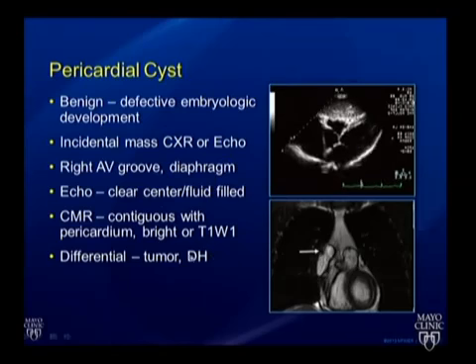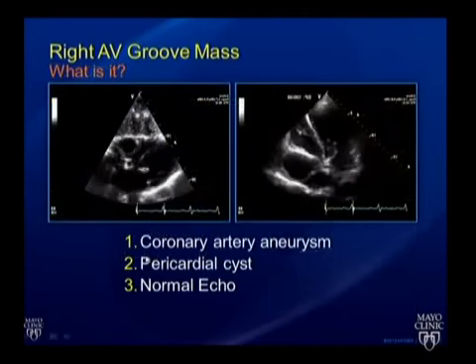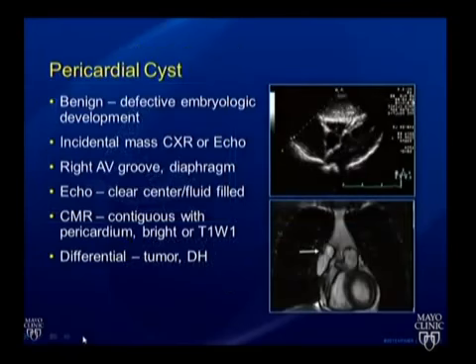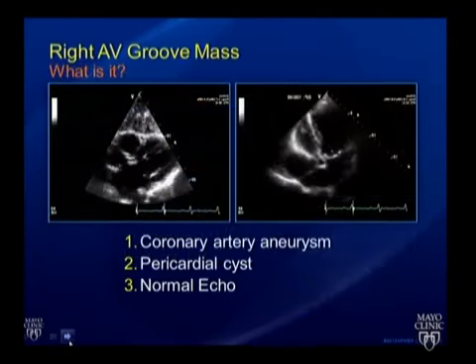And the concern always comes up, is this a tumor or not? One of the things we can do in the echo lab is we can give contrast, and I guess maybe I took that slide out, but if you give contrast, what do you think will happen to our cyst there? Nothing, right? It will just be lighting up in the heart chambers, but the cyst itself will not light up. So that can help you out.